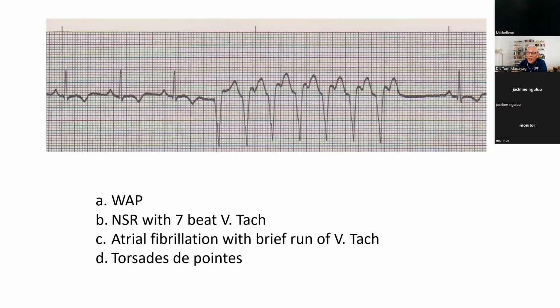Okay, so the correct answer here is that it's a normal sinus rhythm with a 7-beat run of ventricular tachycardia. Okay. So why is it a ventricular tachycardia?